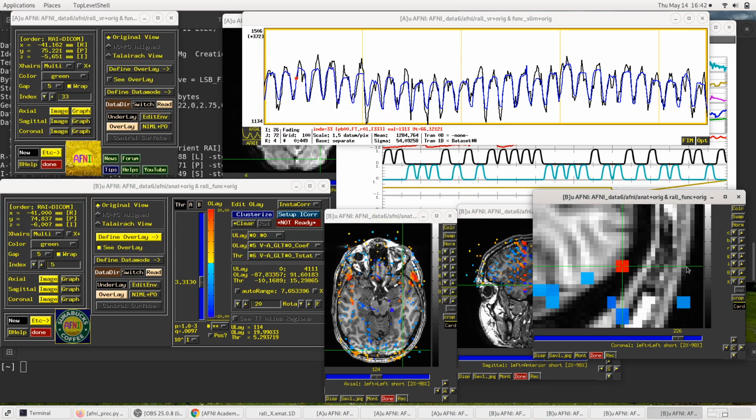So now what do we actually see at this voxel? We see a contrast value of 20. Where does the 20 come from? This contrast is V minus A, and a single line contrast is just some linear sum of the beta weights that it applies to. In this case, it's the visual beta weight minus the auditory beta weight.